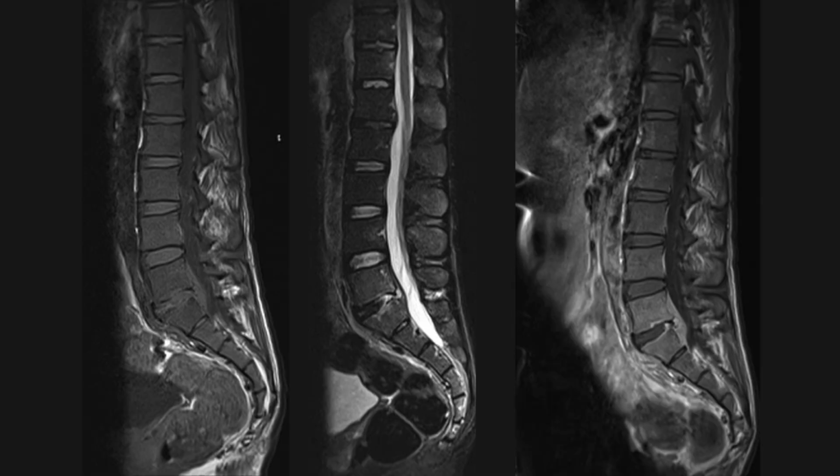Now moving on to the MR lumbar spine, and this is where it really gets interesting. The T1 weighted images show diffuse reduction in bone marrow signal, which is pretty indicative of infection. We also see loss of disc height at L5S1, along with irregularity and erosion of the posterior end plates. That's really pointing towards discitis.